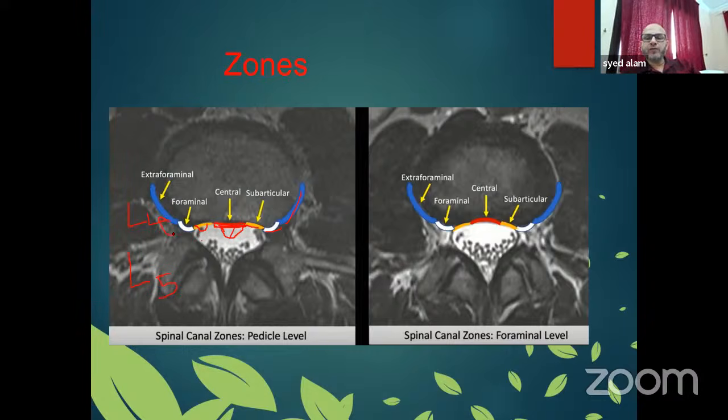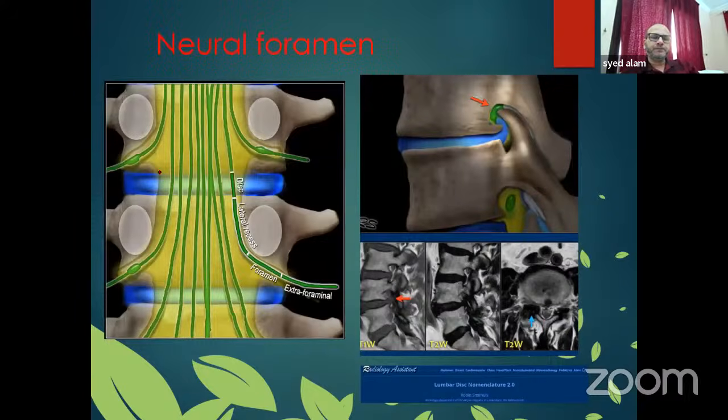I will show you one more time in the practical also. This is the neural foramen.